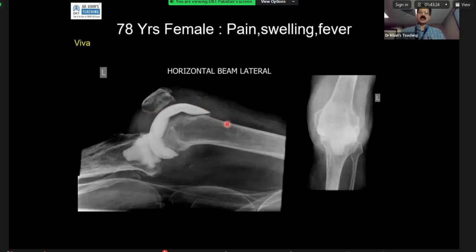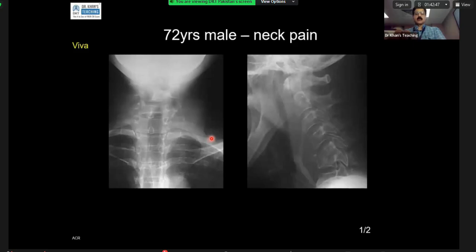Key finding in this case is this lucency. Okay. You see this lucency. This is a classical exam film. This can come in your rapid reporting also, that kind of a case where between the prosthesis and the parent bone, you should not have this lucency. This means a bit of loosening. And with that loosening, and with this, you pointed out there's a bit of effusion here, you call it that this is infection. So that is the key finding, this lucency. Yes, please.